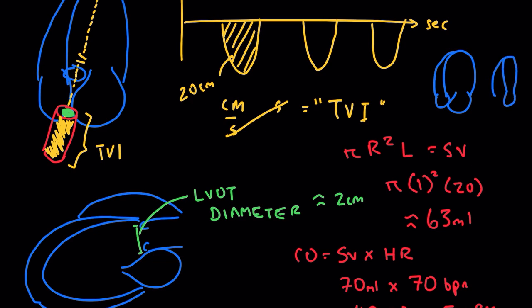I'm exaggerating a little bit here, but if we were to figure out from the apical 4 chamber and apical 2 chamber a volume here, and another small volume here, and we take the difference between those, wouldn't that also be the stroke volume? And the answer is yes, that actually could also be the stroke volume. So that's another way to check your work.